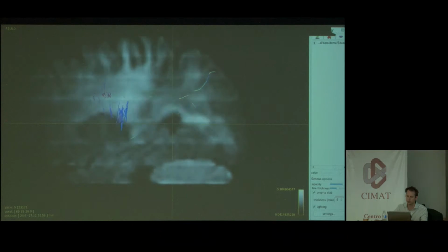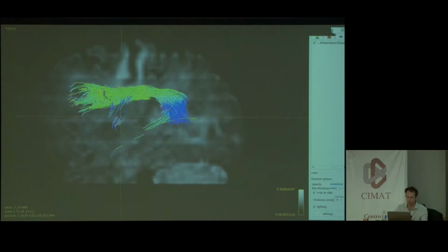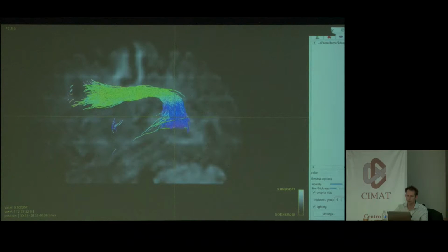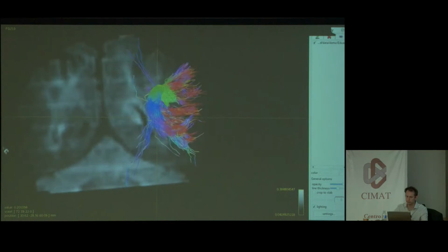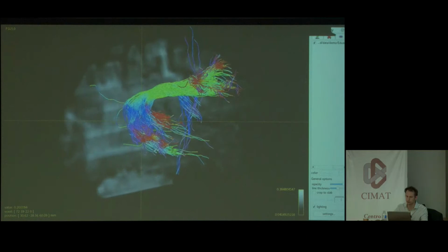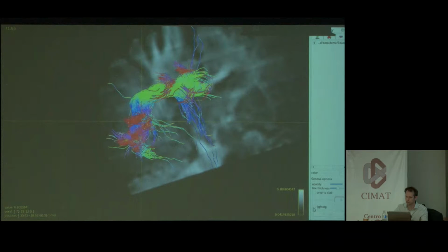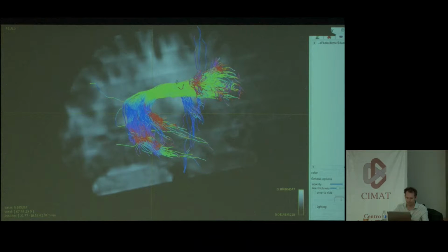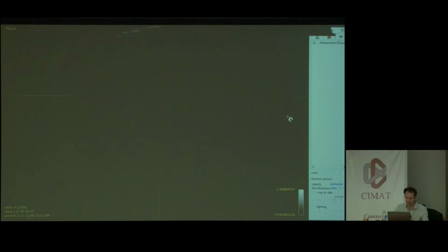And so there we go. I've got a bit of striatal fibers as well, but hey, I don't know. That's probably because, yeah, they come from there. So, there we go. In arcuate. And that's, let's try and kill my laptop. Go for it. There we go.